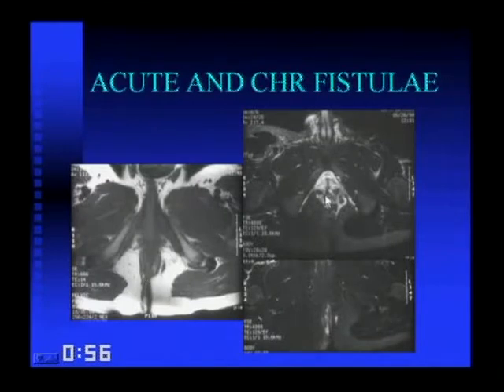Here you can see there's a bright tract here that is the beginning of a fistula. Here you can actually see the little fistula coming out and splitting into a T, sending a tract anteriorly and one posteriorly. As you go more caudally, this tract here continues down and went all the way down to the skin surface. Notice the surrounding fat is black. This was the chronic fistulous tract. If you look on the other side, this continued down to the skin more posteriorly. All of the surrounding edematous change, and this was an acutely inflamed tract which corresponded with the physical findings.